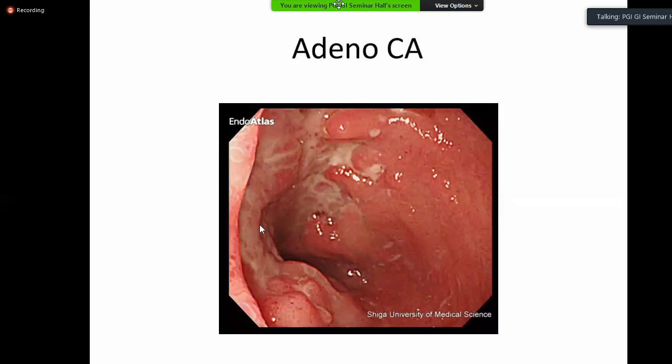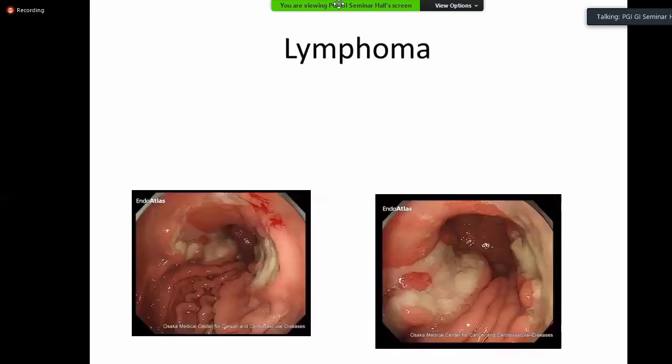You'll describe it as a distal body large ulcerated lesion, geographical, with polypoidal lesions towards the edges of the ulcer at places, no visible vessel, no bleeding, and reduced distensibility. So this will straight away give a meaning that this is most likely a malignant ulcer.